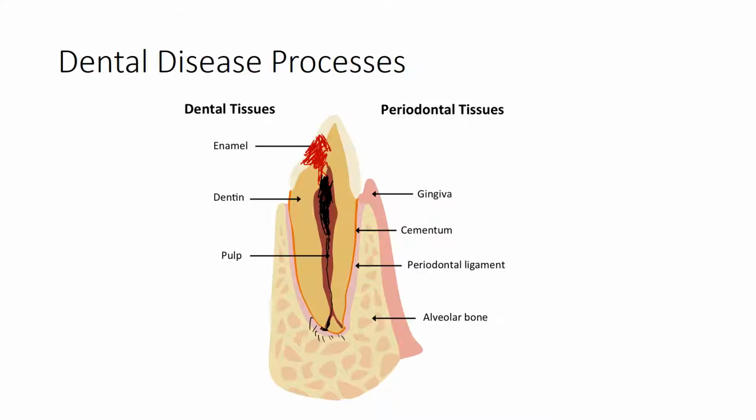So a periapical radiolucency is actually nonspecific, and it can be an abscess, cyst, or granuloma. You can argue whether or not it makes a difference because it all occurs in response to decay. All right, so that is decay.